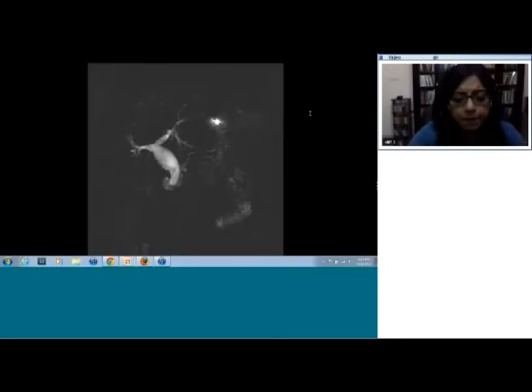So this is the dilated extrahepatic bile duct in type 1 choledochal cyst.